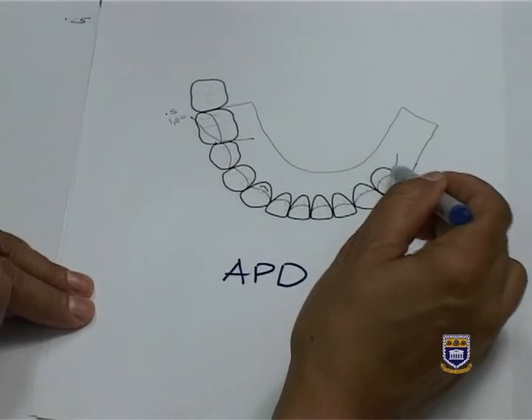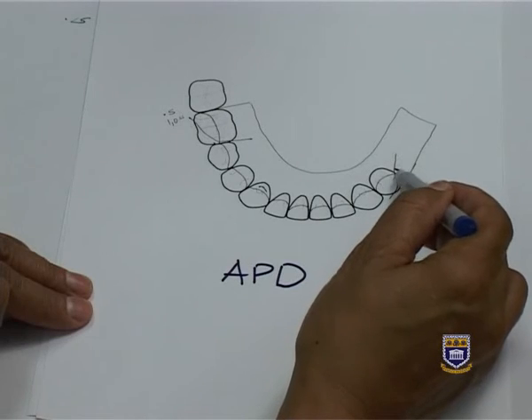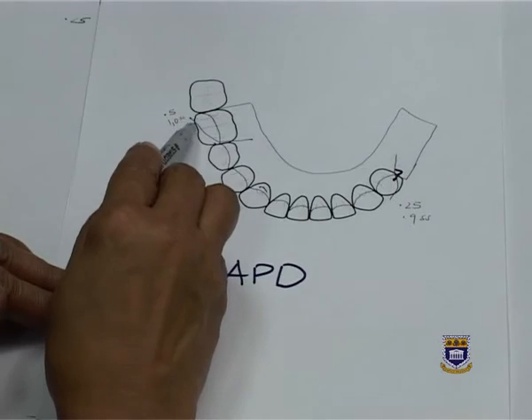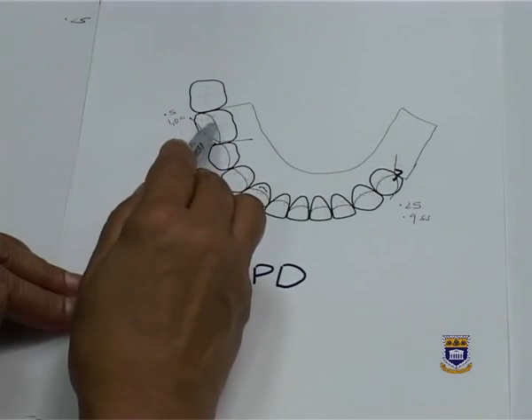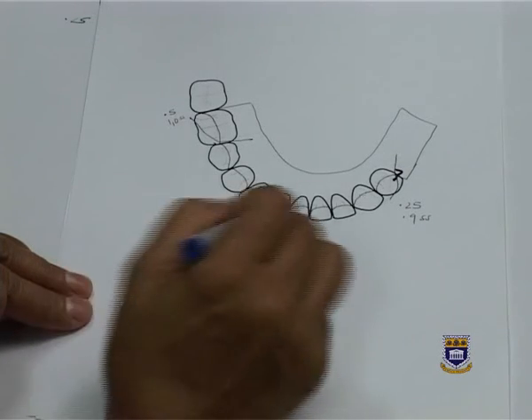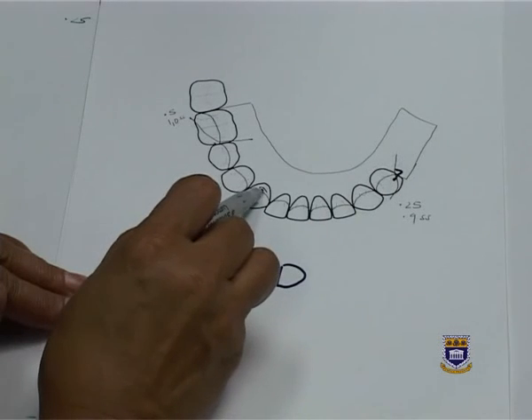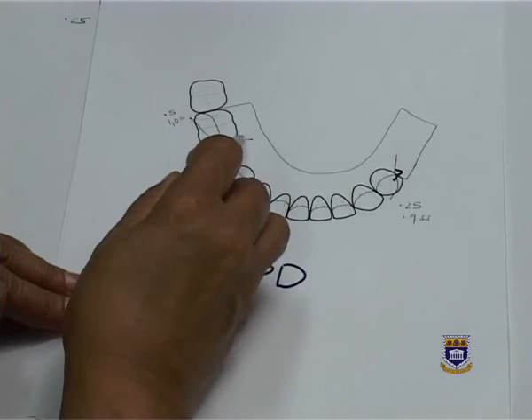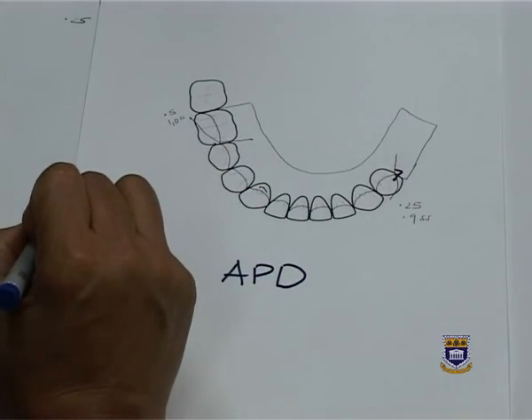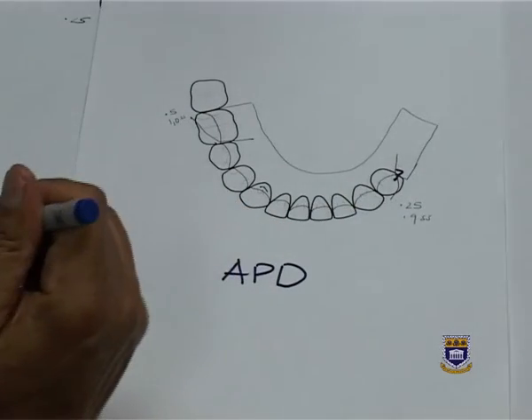I've used a stainless steel clasp on the premolar with my distal rest, which is half round wire. So I've got 1, 2 clasps, I've got reciprocation. Reciprocation is provided by the acrylic partial denture, and I've got my 1, 2, 3 rests, because this clasp also acts or can be counted as an embrasure rest. And this is an acrylic partial denture for a class 2.